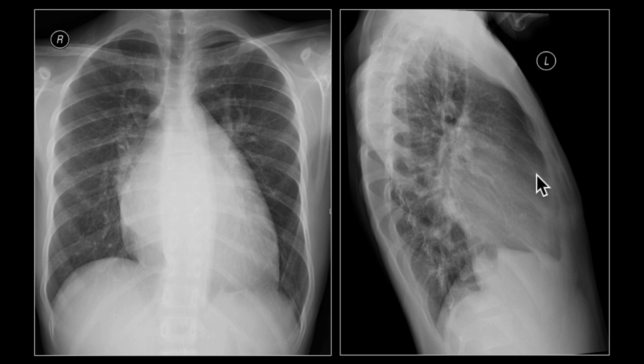We know from normal anatomy that the anterior cardiac border behind the sternum is actually the right ventricular border. Most of the posterior border is the left ventricular border. What you see here as a line that goes all the way down from the chest to the abdomen through the hemidiaphragm is commonly seen, and this is the IVC.